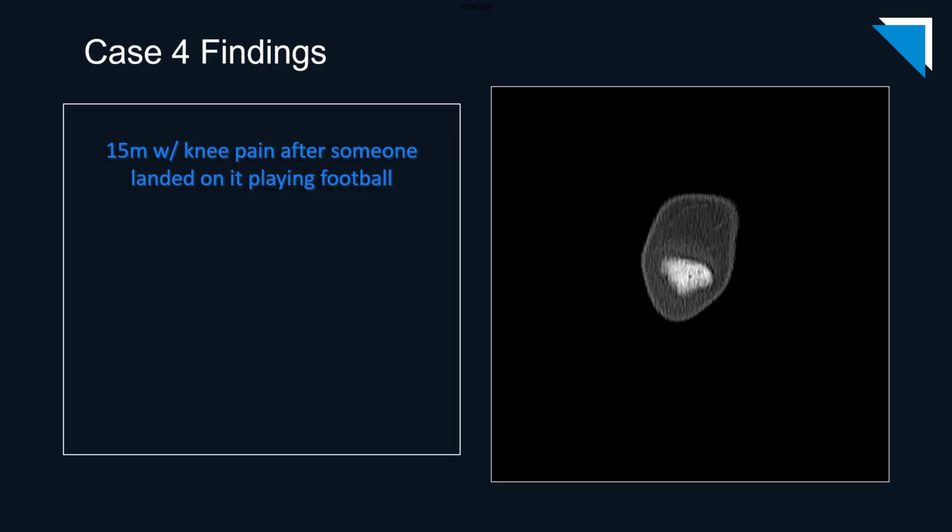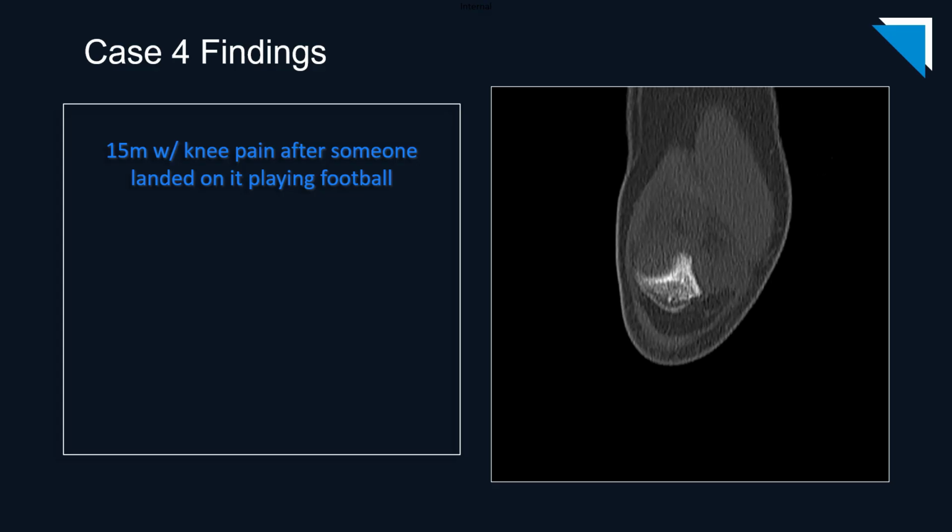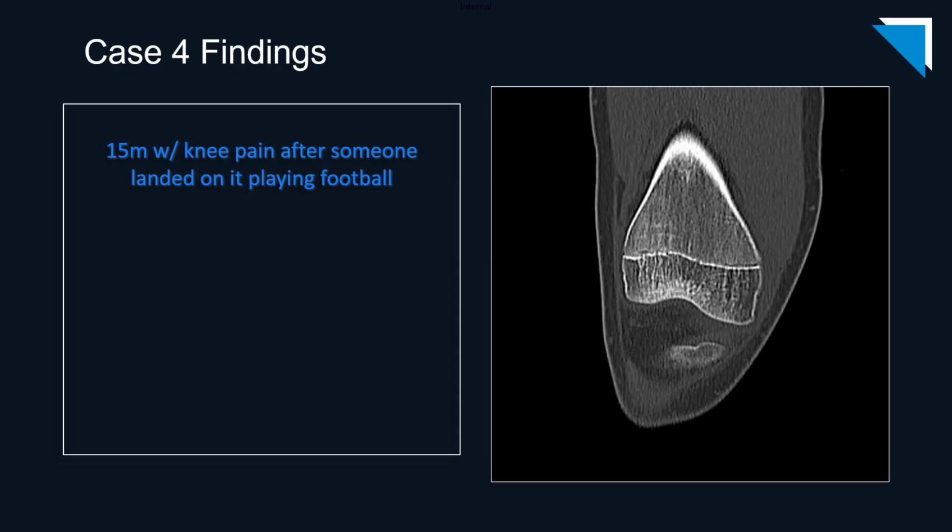Here are the coronal images from the same study. These are, of course, bone windows.